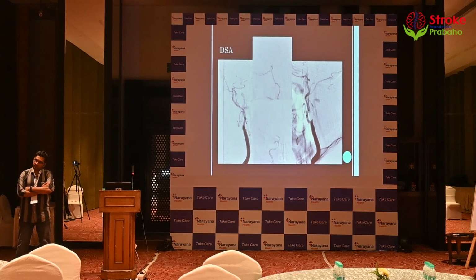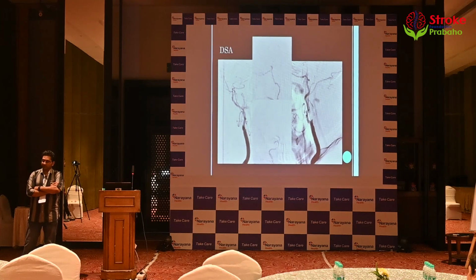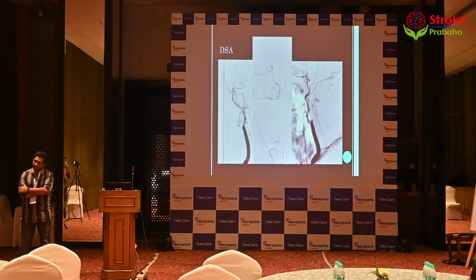Second, this patient has had an embolic phenomenon, no doubt. So whatever has happened to the internal carotid cannot be too old. It has happened in the very recent acute past. Acute on chronic, maybe. And it's not only a watershed infarct that has happened, there has been some embolus which has traveled into the parietal region. So possibly the neck is the culprit lesion, where there was an acute lesion that has gone into a total occlusion after sending some showers. Based upon these MR findings, if the patient still passes the provocative test, then best medical management would be the way forward. If the symptoms recur, then you would be obliged to go in and do whatever you can to open him up. That would be the clinical way of doing things.